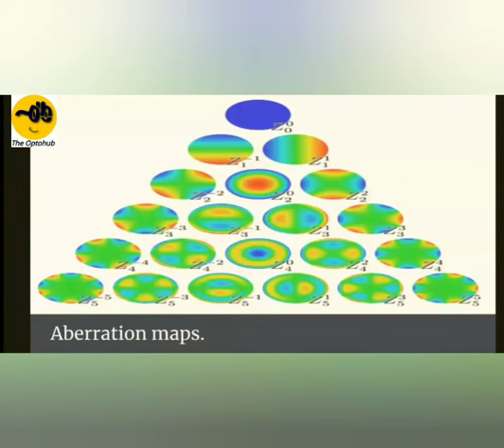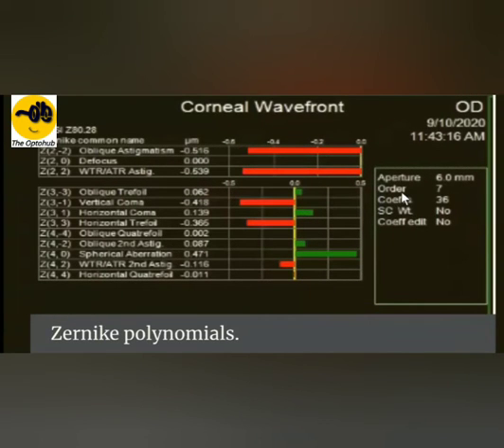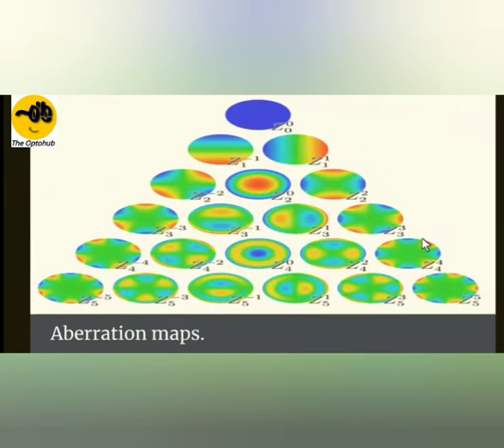And if a patient has undergone RK in the past, then the patient will have a lot of quadrifoil or oblique quadrifoil and so on, as well as spherical aberrations, and with the rule or against the rule secondary astigmatism. So there are specific patterns you observe in specific cases, but they wouldn't have much indication in practice. But yes, one should remember that these patterns give you an idea that the patient has some genuine problems arising from the anterior surface of the cornea. Right. So that's how it is.